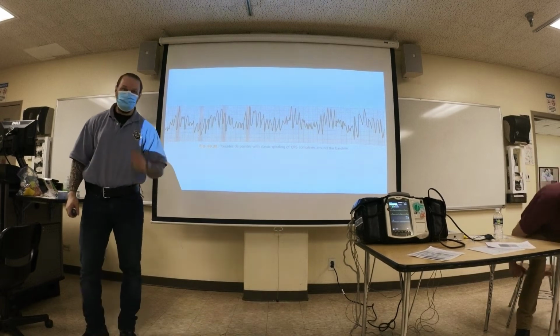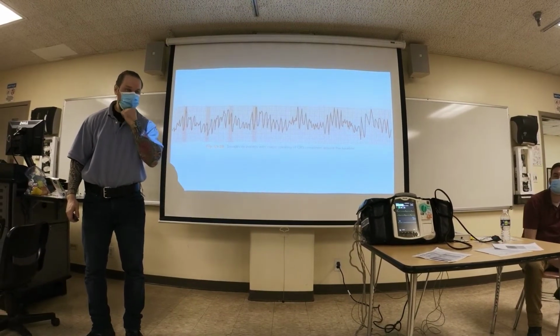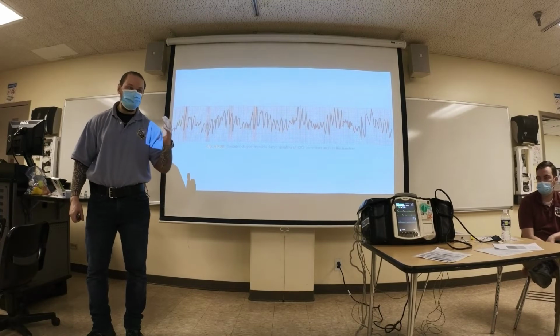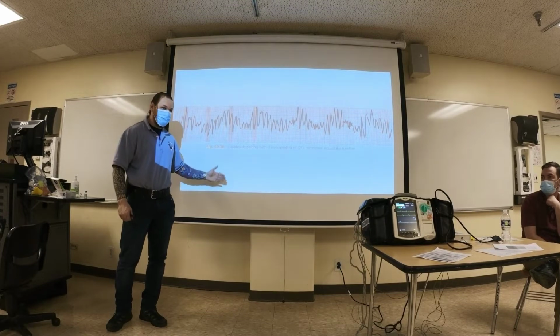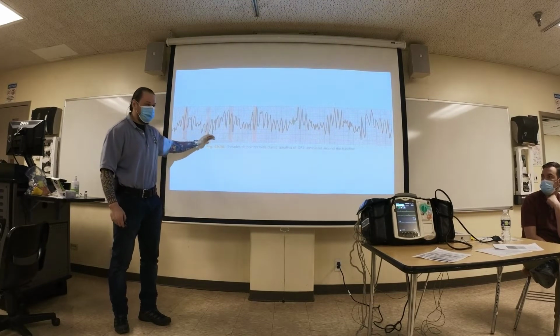Last time we went through monomorphic ventricular tachycardia. I'm going to go through polymorphic ventricular tachycardia and treatments. They are different in terms of treatment. That's why I want to go over it. If you give the wrong treatment, there's a high potential of causing death to your patient or serious injury, right? So as you can see, this is a polymorphic ventricular tachycardia.